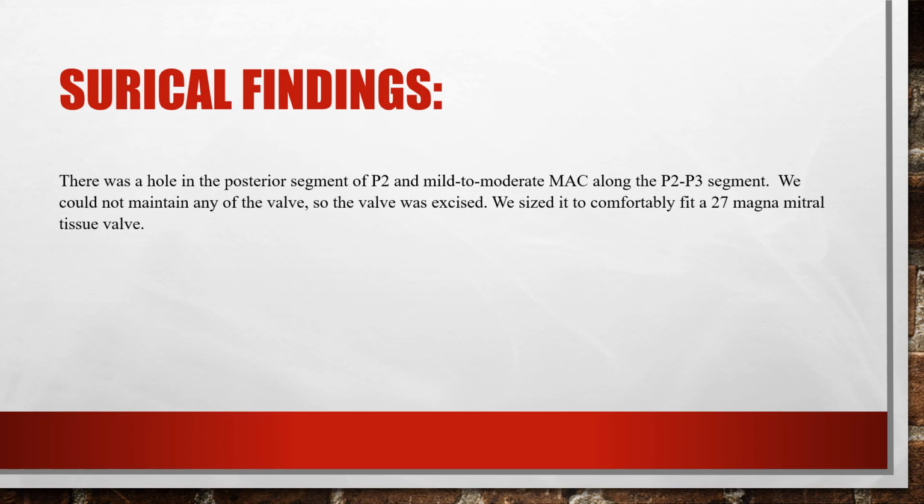So the patient went for surgery, and the surgical finding showed there was a hole in the posterior segment of P2 and mild to moderate MAC along the P2, P3 segment. They could not repair the valve, so the valve was excised and replaced.